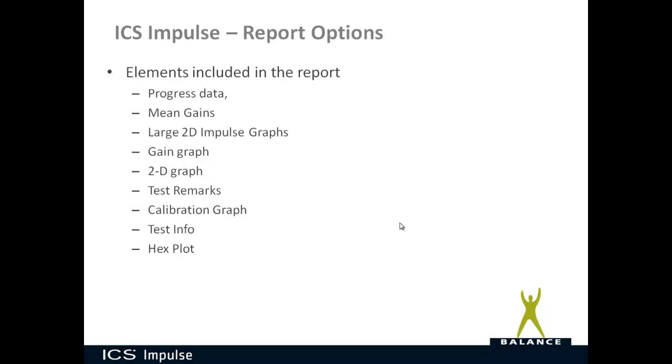You can do test remarks, the calibration graph. So when you do that calibration check, do you want to include that in your report? Test info, that's the analysis versus the collection data. And then the hex plot, which is new for the version 2.0 software.